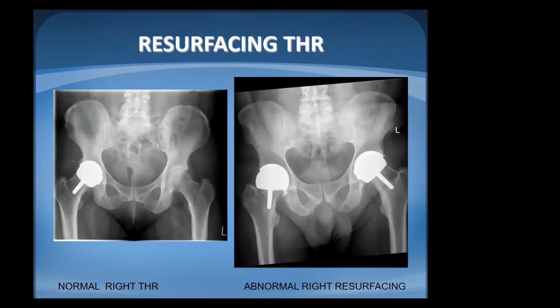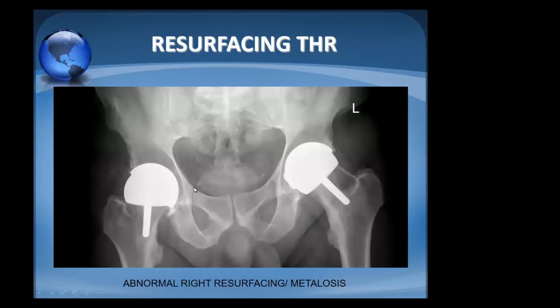Another, we've discussed this partial type of total hip replacement, where the femoral head is replaced with a stem preserving the femoral neck and the femoral shaft, and with replacement of the acetabulum, so resurfacing. Resurfacing can have its own problems like loosening and migration, as you can see, with valgus deformity and basically an abnormal position of the stem against the acetabular cup. Another example, good placement and abnormalities. Remember the metallosis that we've discussed.